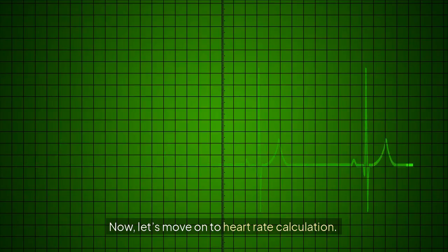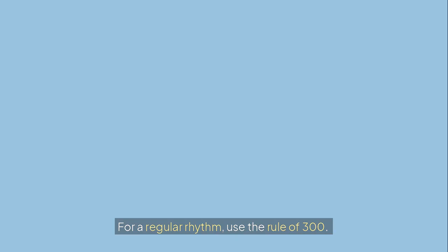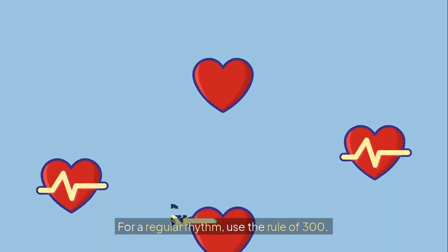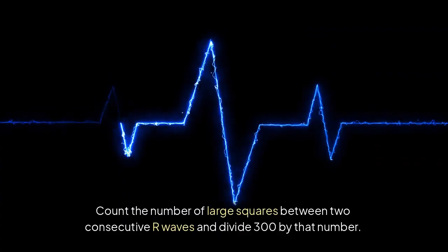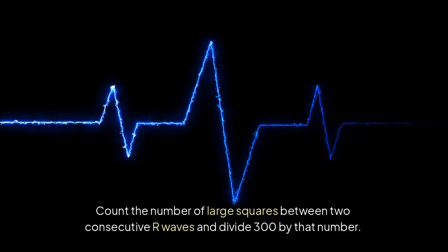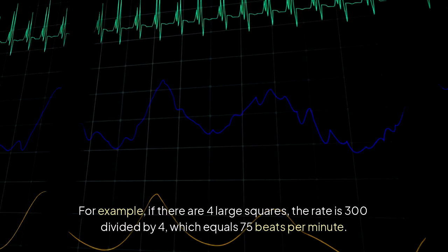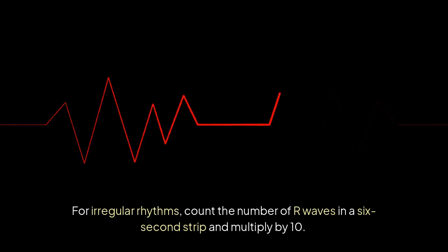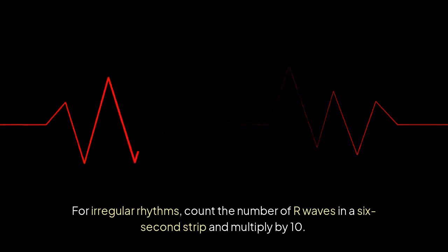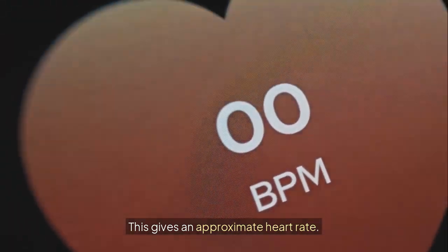Now, let's move on to heart rate calculation. There are several methods to calculate heart rate from an ECG strip. For a regular rhythm, use the rule of 300. Count the number of large squares between two consecutive R waves and divide 300 by that number. For example, if there are 4 large squares, the rate is 300 divided by 4, which equals 75 beats per minute. For irregular rhythms, count the number of R waves in a 6-second strip and multiply by 10. This gives an approximate heart rate.